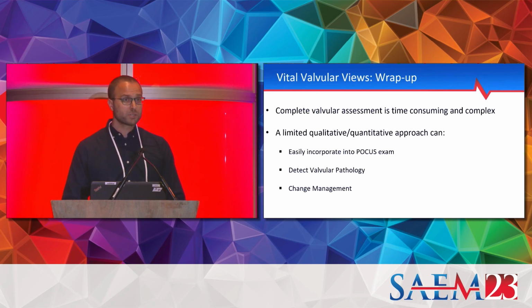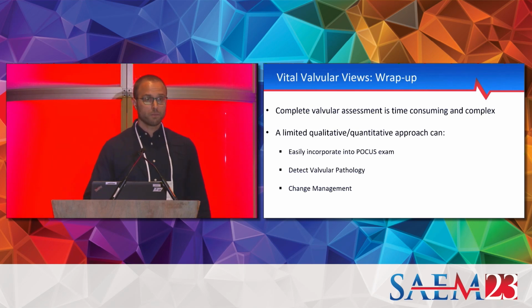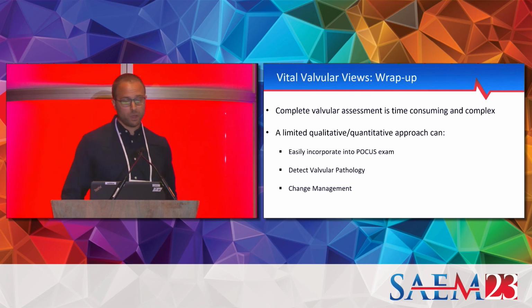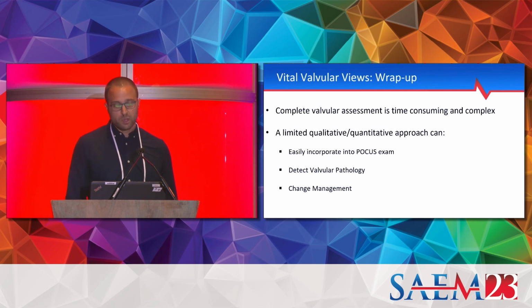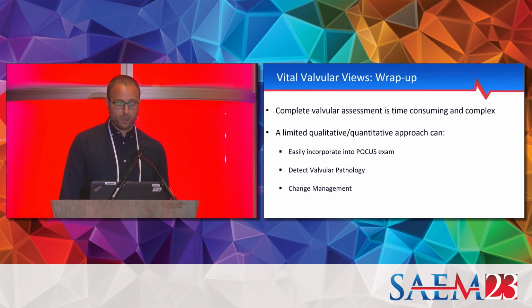Truthfully, it takes just a few extra seconds once you get familiar with how to access the functions, and it truly can change management and your diagnosis for the patient. Because you may have a normal 2D image of your patient's heart, but if you don't throw the color Doppler on, if you don't throw spectral Doppler on, you're going to end up missing a lot, and you'd be surprised at the amount of pathology that you'll end up finding if you start to regularly incorporate this into your workup, into your patient management.